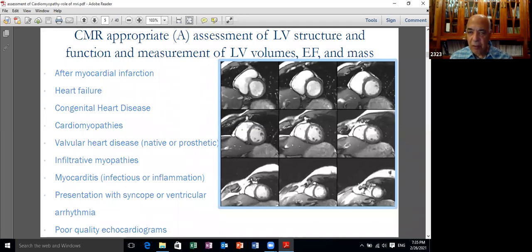The role of the operator is not as much as in echocardiography, but much more important, we have no assumptions like using formulas for the prolate ellipsoid, which is used sometimes in echocardiography and always in contrast ventriculography. We can trace the endocardium and the epicardium. We can trace it in systole and in diastole. The machine does that quickly.